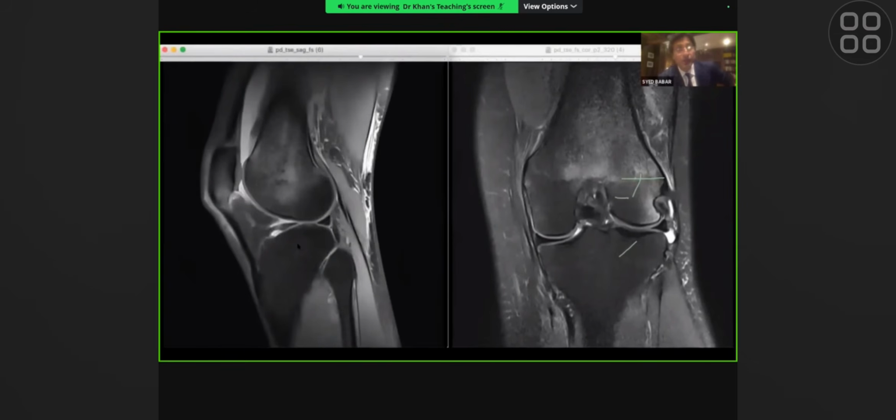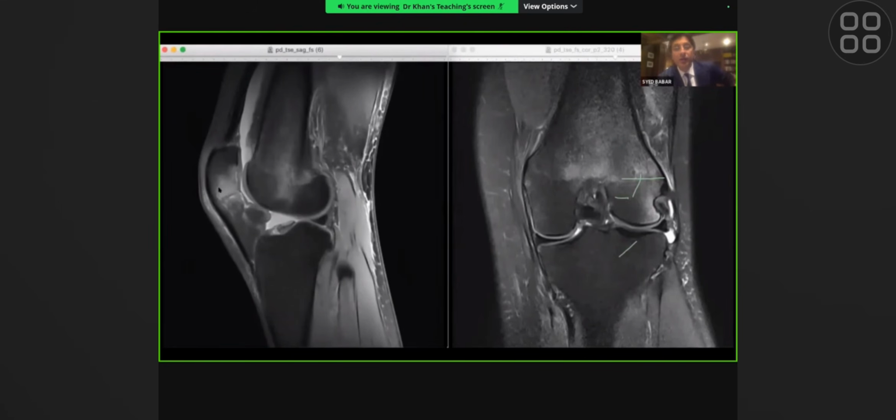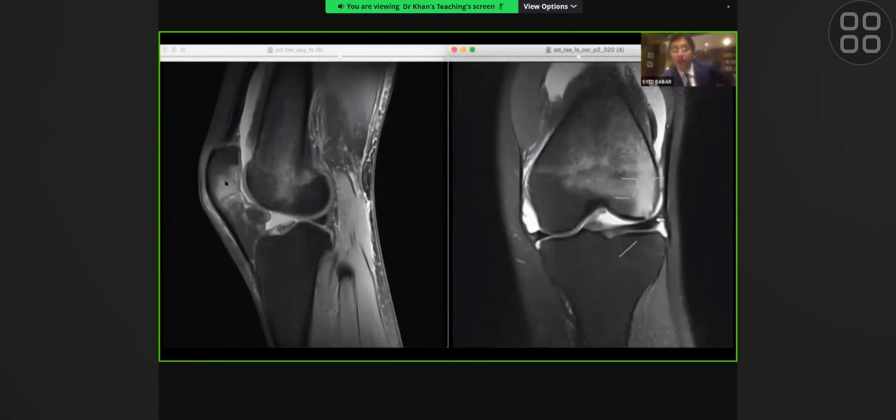We keep going forwards. And as we are going forwards, can you see that there is additional bone bruising? There's additional bone bruising coming in view where? Patella. You keep going, look at the bone bruising here. So that should immediately alert you to only one particular diagnosis. Whenever you see marrow edema of the lateral femoral condyle or lateral femoral trochlea, and you see corresponding marrow edema of the patella, you start thinking about transient lateral patellar dislocation, even without the axial.